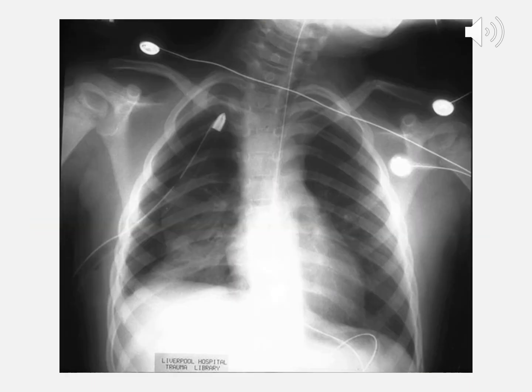All right, so there's a lot going on with this patient. See if you can find it. Maybe cut the volume off and see if you can interpret this one. Overall, this looks like a young person. Right and left humeral heads look like they have some growth plates, diaphysis there, metaphysis. He's got a left midshaft displaced clavicle fracture. He's rotated towards the left. He's kind of curled up. It's a difficult position. He's got a right-sided pneumothorax, probably 25%.